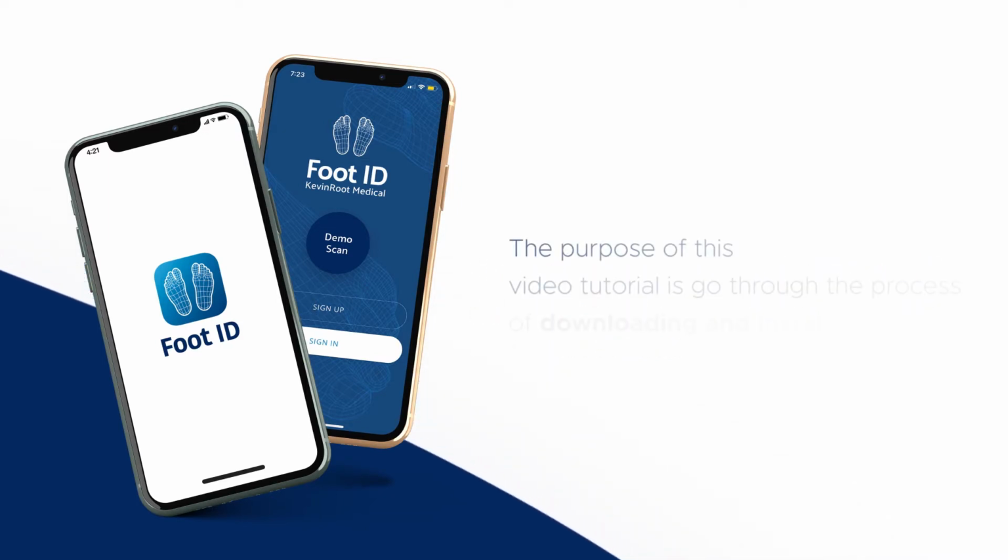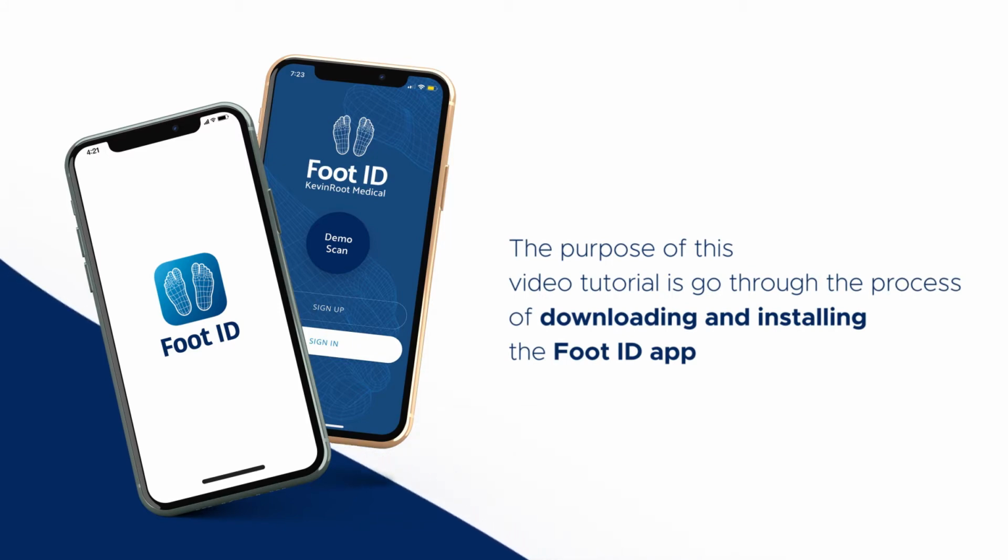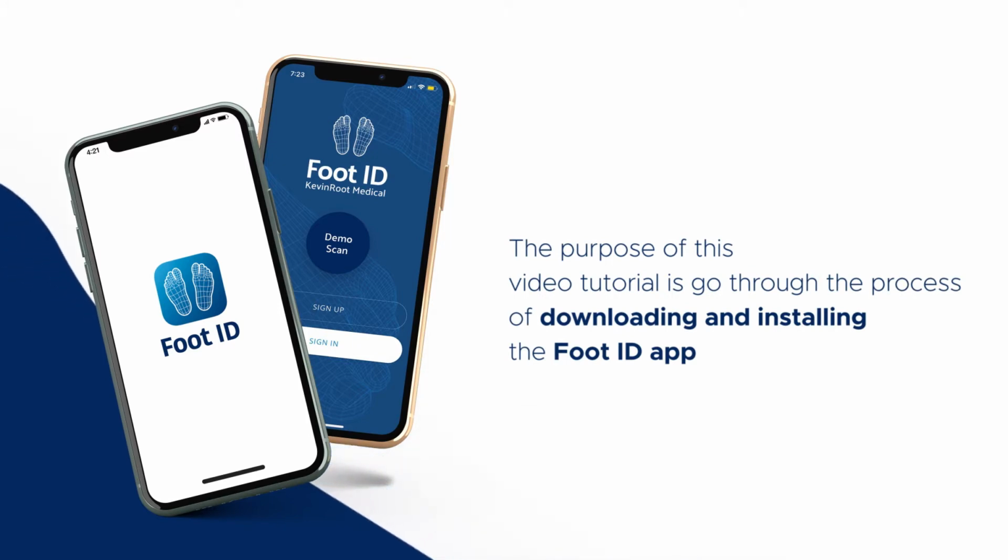The purpose of this video tutorial is to go through the process of downloading and installing our Foot ID app onto an iPhone or an iPad.